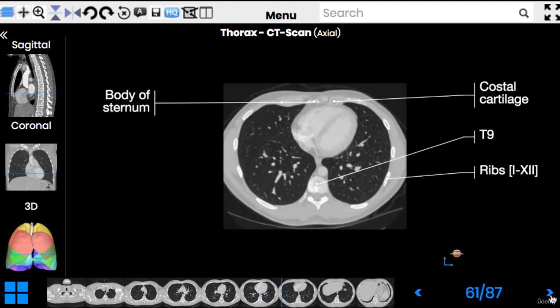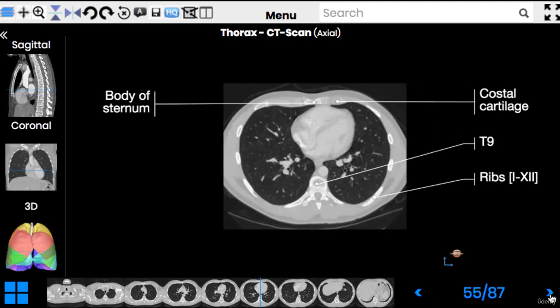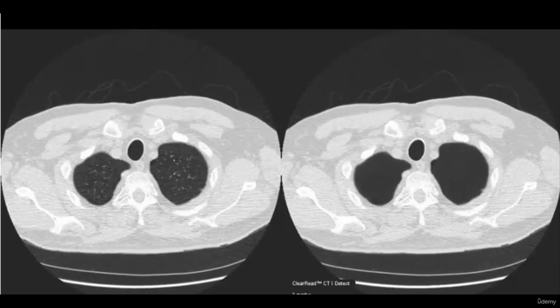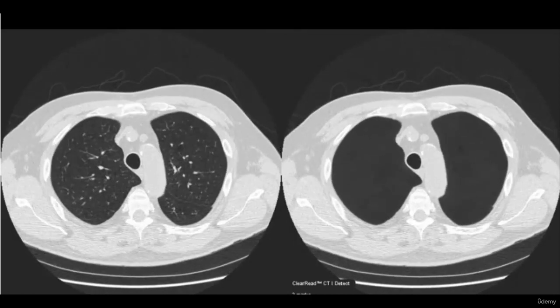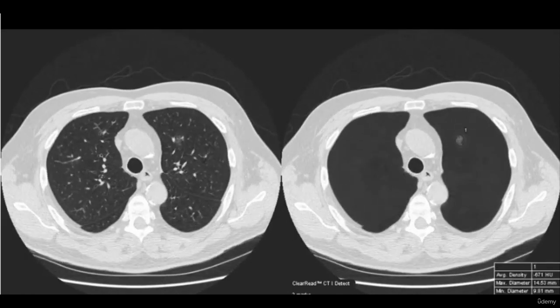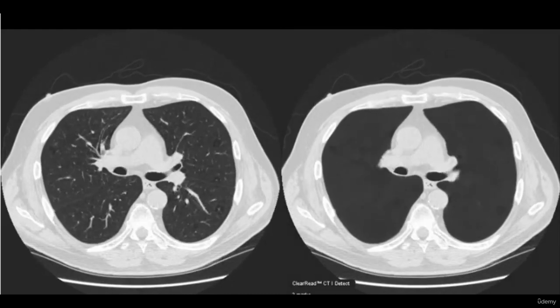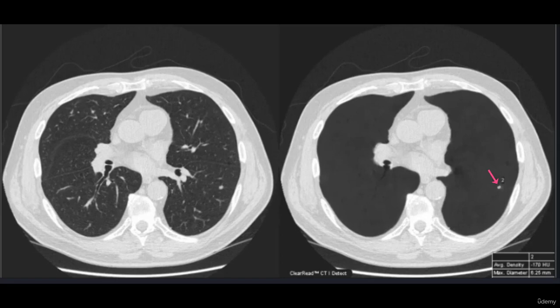If any pathological structure appears, how do you differentiate the nodule from the vessel or from the bronchus? They use special settings, the vasculature and bronchial tree suppression settings. Then vessels and bronchi just disappear from view, and only pathological nodules become visible then.